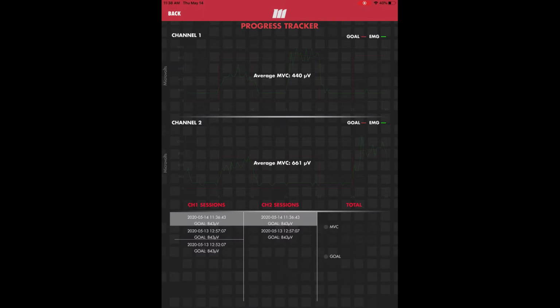Note that this is not the peak microvolt level achieved, as EMG signals have a strong peak and decay pattern, but we are rather reporting on the level of activation a patient can achieve and sustain when working at maximum. This enables mTrigger to encourage patients to work their hardest on every rep and helps them understand the value of their work in real time.